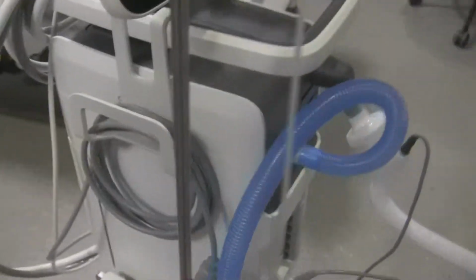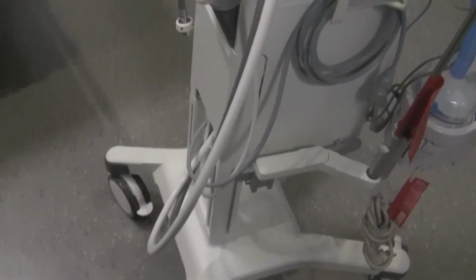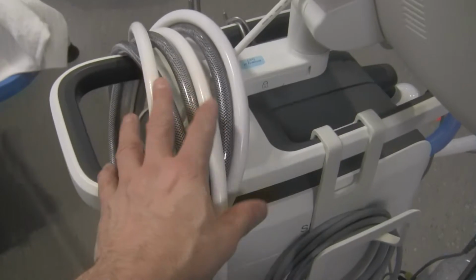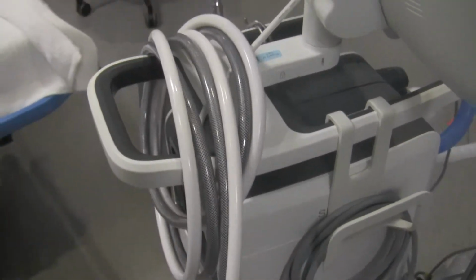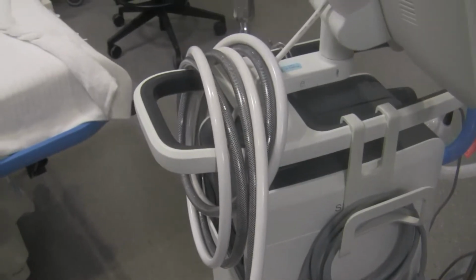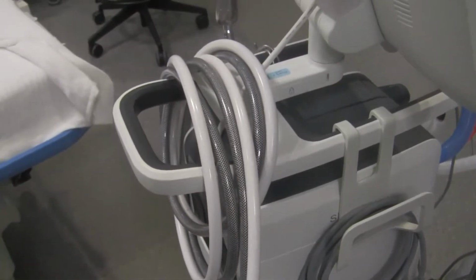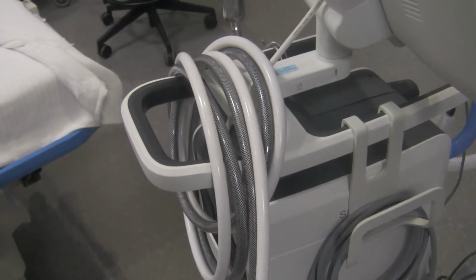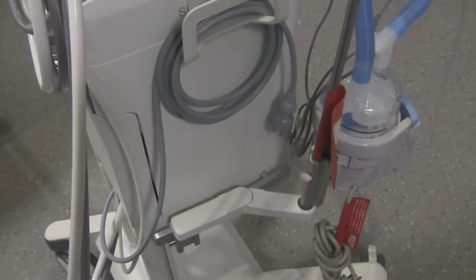Now what makes this ventilator run is electricity, so it has to have a power cord. It needs to be plugged into the electrical outlet, and it's also going to have these gas hoses right over here. White is for oxygen, and black and white, here in Canada and through most of the world, is medical air. So you have to hook these up to the appropriate station outlets to make them work, and your cord for the ventilator also needs to be plugged in as well.